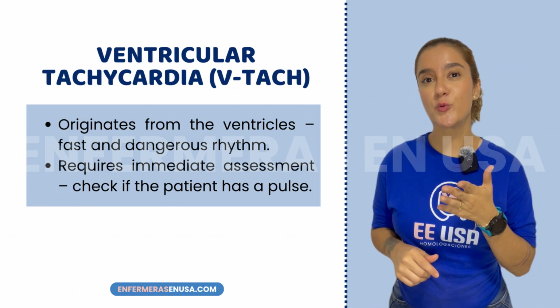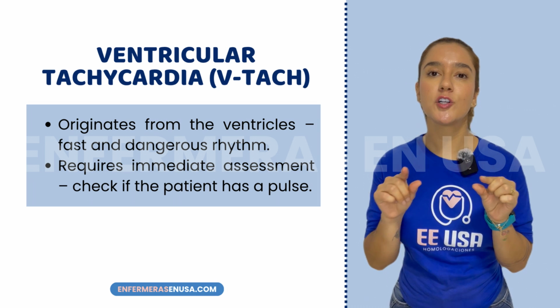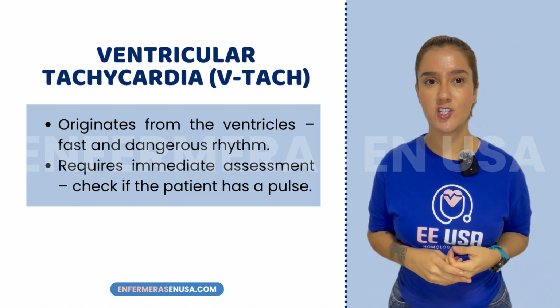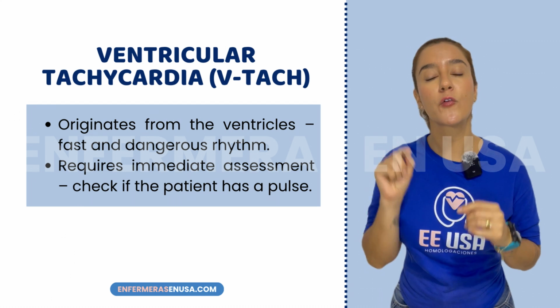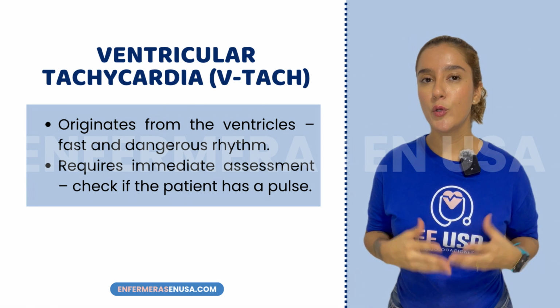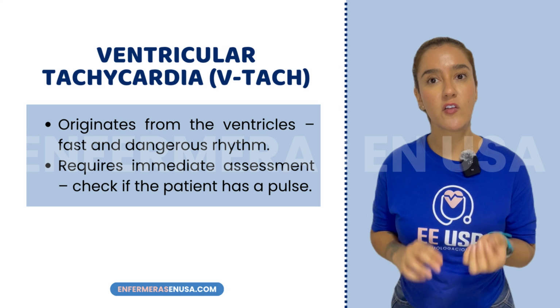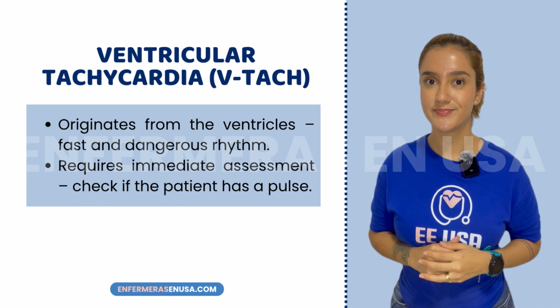Now, let's move on to the rhythm that can be life-threatening if not treated quickly: ventricular tachycardia, VTach. Here, the electrical impulse doesn't come from the sinus node but from the ventricles, causing abnormal and dangerous contractions. Whenever you see this rhythm, always check for a pulse first, because what you do next depends on it.